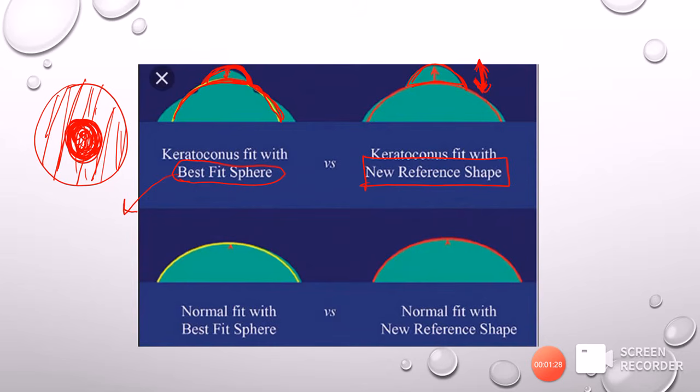Such a new best fit sphere, calculated by excluding the conical part of the cornea, is called the enhanced best fit sphere.